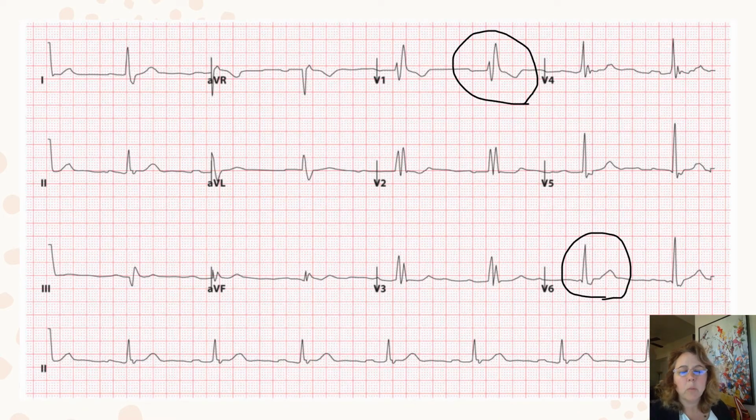All right, so when we look at an EKG, let's actually go back a second and ask, what is this person's axis, first of all? Leads 1 and 3 are the two leads we're going to look at for axis, and we see that 1 is upright, so I know that it is somewhere on the right-hand side of that plus sign. And then 3 is kind of biphasic.